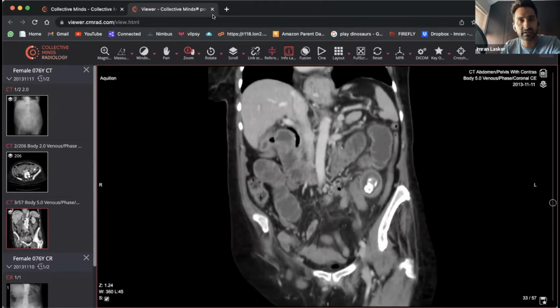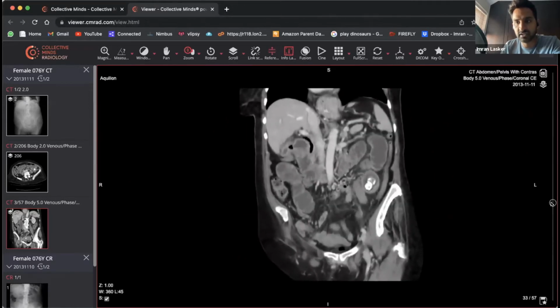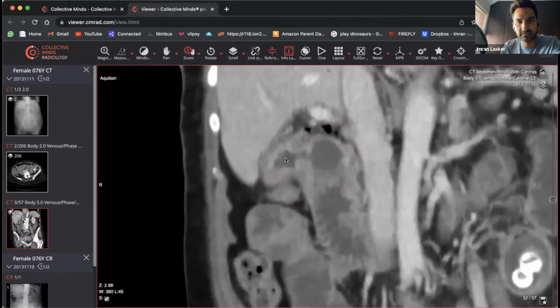So basically what's happened is that the gallstones that were sitting within the gallbladder have been there for so long, it's probably caused chronic inflammation. And as time's gone on, it's resulted in fistulation between the gallbladder and the first part of the duodenum. Now, if we zoom in, I'm going to just show you, look, there's that defect there, but on a different view. Can you see that? A nice little defect there going like so, and those are the gallstones.